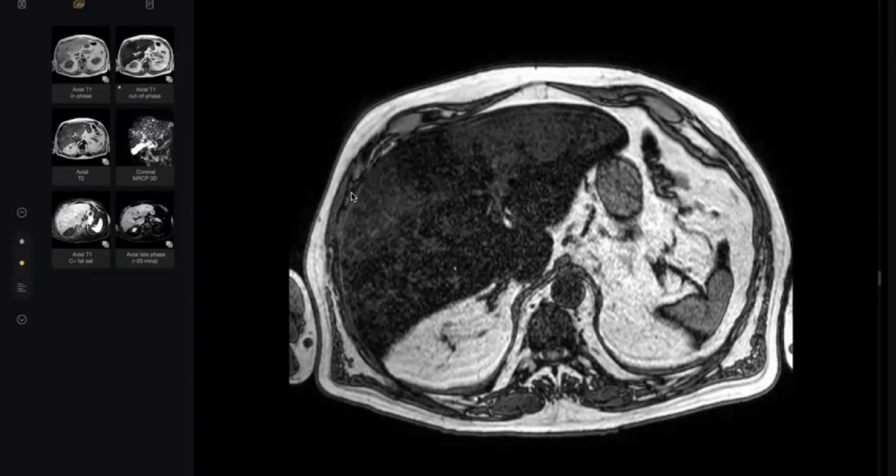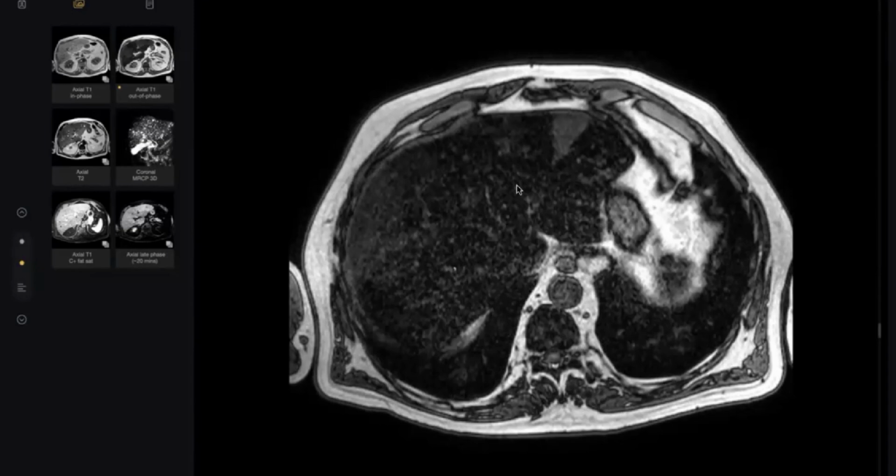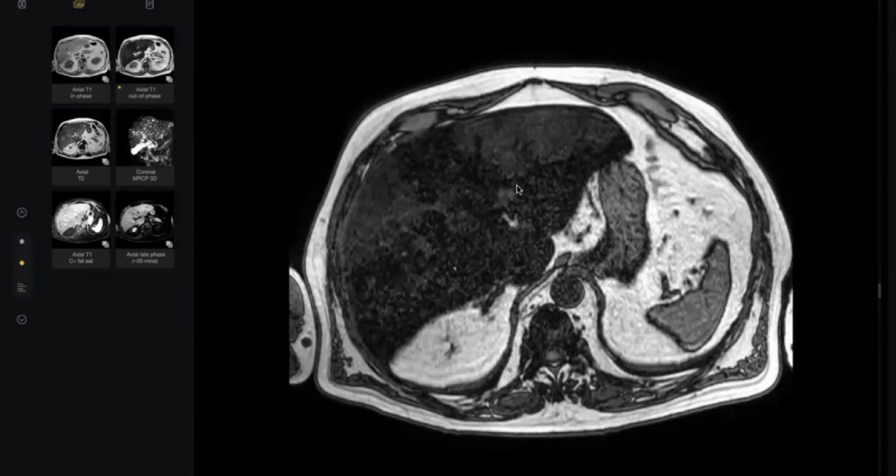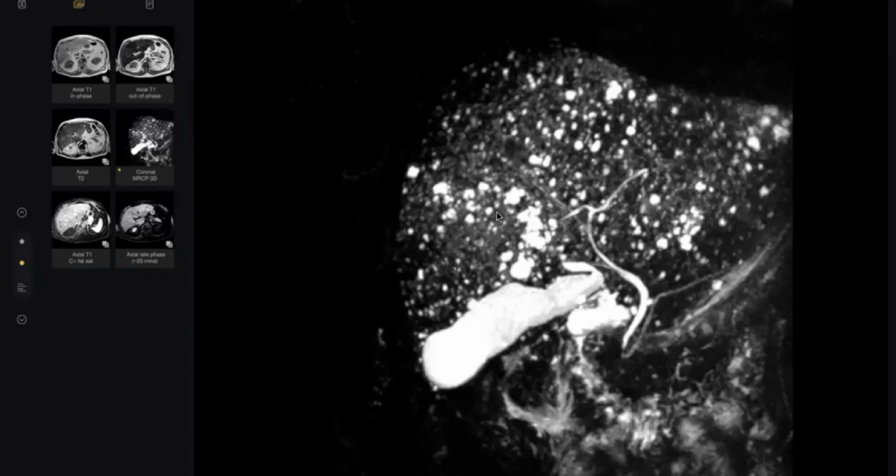My findings include diffuse fatty infiltration along with multifocal T2 hyperintense lesions, which could represent biliary hamartomas. Not diffuse, doctor. This is patchy, look, geographical. Yes, this is patchy focal fatty infiltration, which is becoming hypointense on the out-of-phase images. And the previously seen T2 hyperintense lesions could be biliary hamartomas because they were very regular shaped with no soft tissue component. I would confirm my findings on post-contrast images to look for any enhancement. Very regular or irregular?